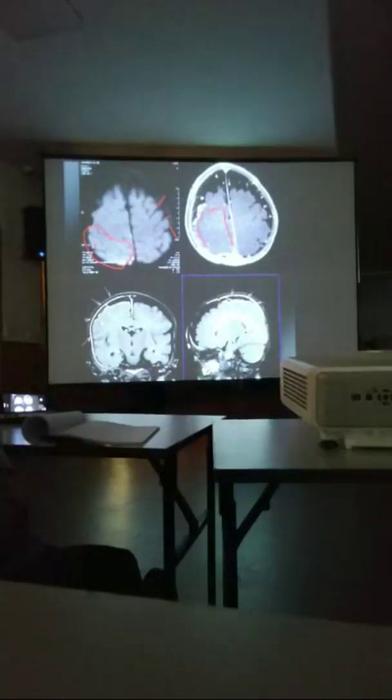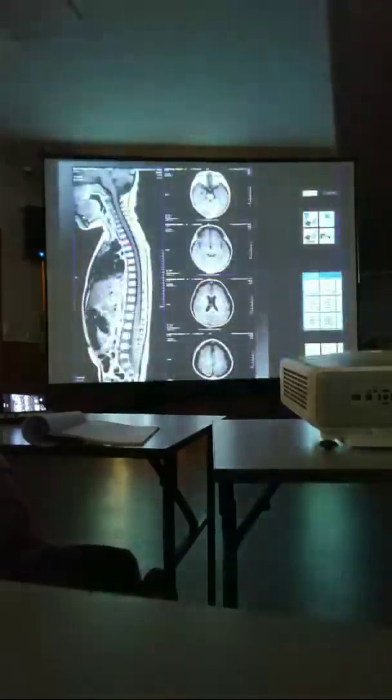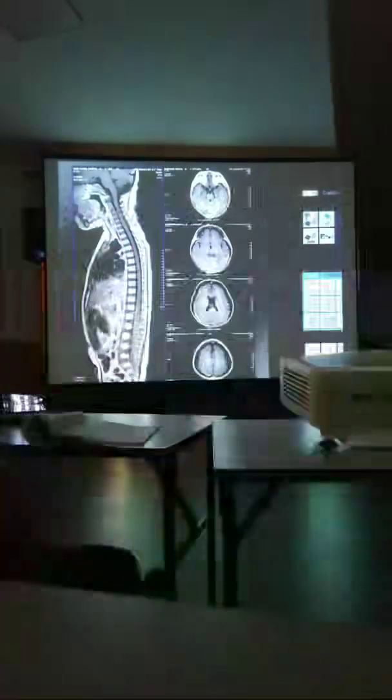And you can see that in this case the pachymeninges are also involved. You can see the involvement of the pachymeninges also. And the subdural effusion, you can see the subdural effusion. So these are very classical. Please carefully look for subarachnoid spaces. It is very important. Cranial means you should look at the spine also. It is a craniospinal meningitis.